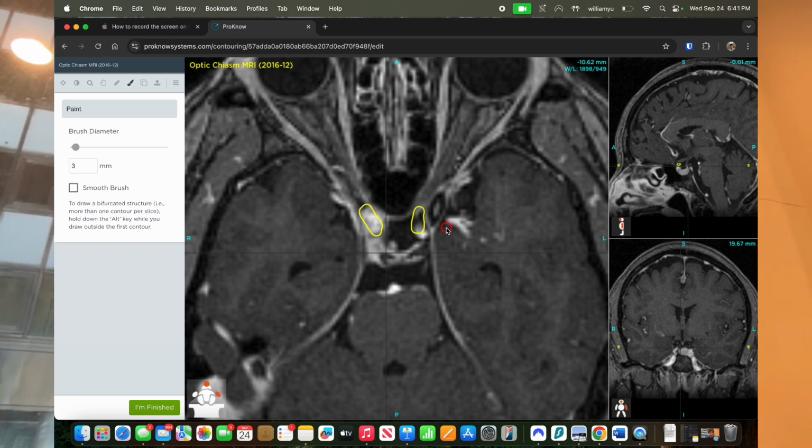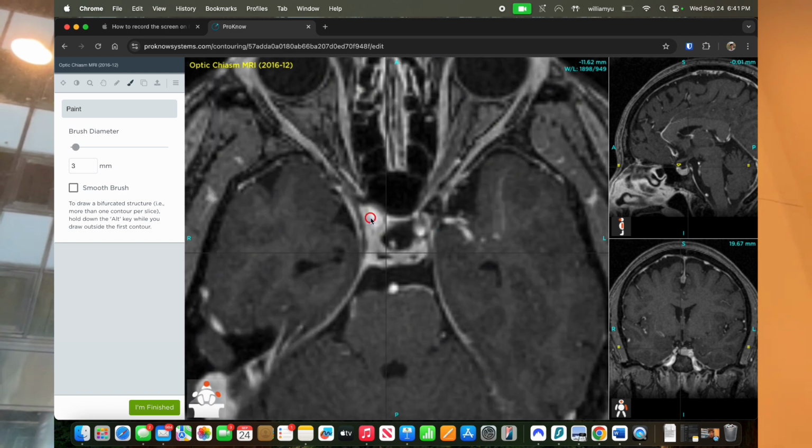I felt more confident doing the CT one, even though I couldn't see anything. Maybe when you see so much, it makes you second guess yourself. I don't know.